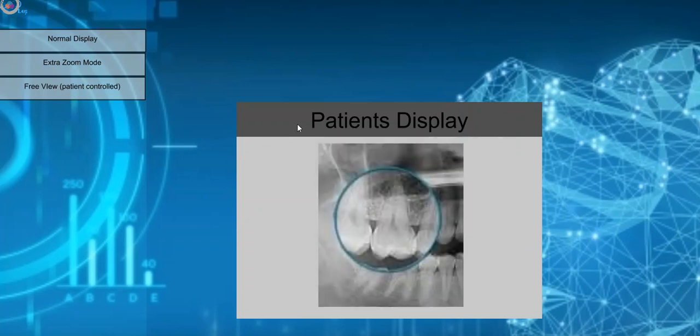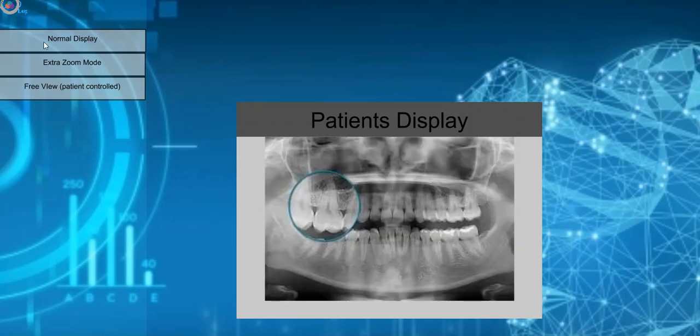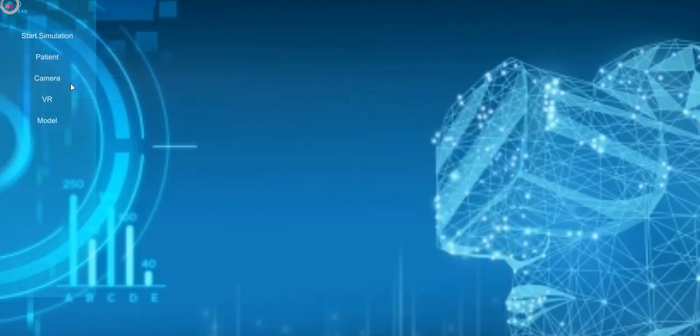You're going to go ahead and click. What it does is it zooms in on the area, so if a patient has a hard time seeing, this allows them to see their teeth more closely. And we can move back and forth seamlessly for the user experience. And we'll head back over here for a third task.